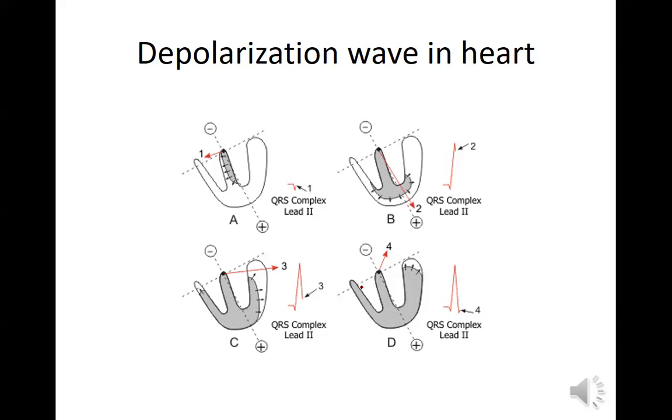So of course, the big T wave is not just going to be in lead 2. It's in the blood, so it's going to be in every lead. The big T wave, right? So that's a good question that he asked. That makes me think it depends on something that's systemically going on. Right, or like deep breathing. Yeah, it could be deep breathing that's causing that artifact, right? Hiccuping. I always say hiccuping.